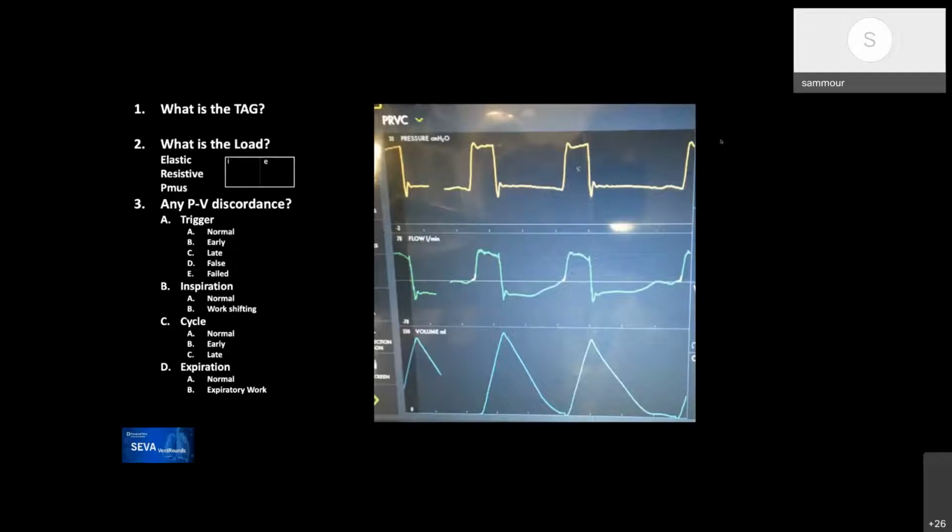And since the I times of the three breaths that I can see are similar, I don't have any reason to believe this is IMV, so this is PC-CMV. And since I know this is PRVC on the Servo, this is PC-CMV adaptive. Correct. This is me cheating here. That's all right.